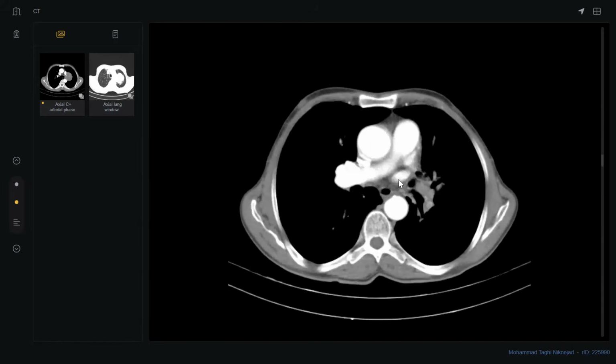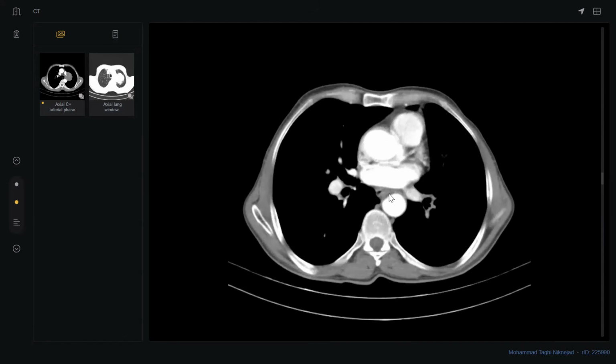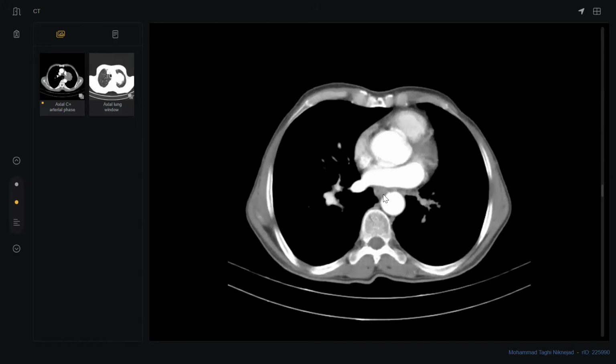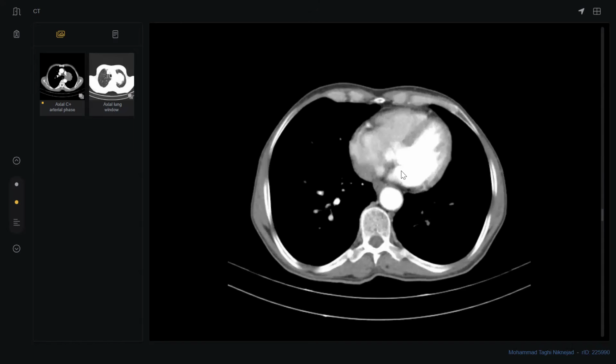What's your final diagnosis? So as I can see, there is almost complete obliteration of the lumen of the esophagus. So this is lung carcinoma, which is locally invading the major vessels and causing pressure effect over the esophagus. I will convey the finding to the referring physician, and discussion in lung MDT is needed for tissue diagnosis and further management.